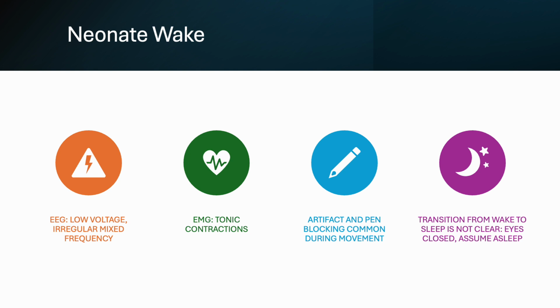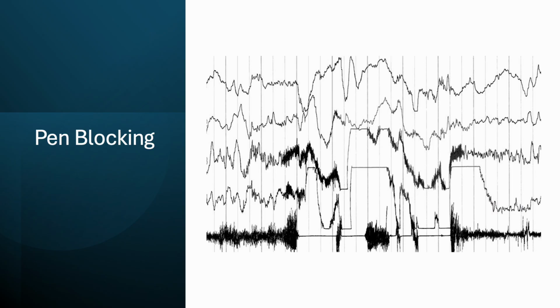For babies this small, the transition from wake to sleep in the EEG is tough to tell. If their eyes are closed, you can pretty much assume they are asleep.